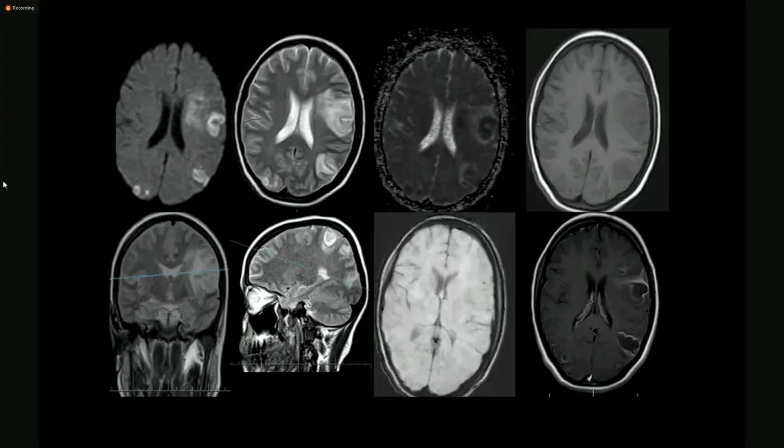Peripheral enhancement. क्या लोब्स आपने बता दी, लोकेशन क्या है इनकी? क्या ये कॉर्टिकल बेस्ड हैं? क्या लोकेशन लोब्स के हिसाब से नहीं, वैसे ग्रे मैटर में है, वाइट मैटर में है, किस जगह पे है? मैडम कॉर्टिकल बेस्ड हैं ये. अच्छा, अगर ये कॉर्टिकल बेस्ड हैं तो आप T2 इमेज देखें, इसमें तो कॉर्टेक्स ठीक नजर आ रही है. जी मैडम, सब कॉर्टिकल. ओके ठीक है. सही. अब क्या करेंगे इसमें?